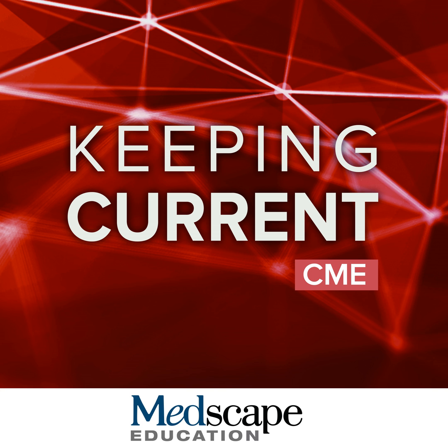Frequently, these contain thrombus. I showed the example of this already, where you've got a magnitude image which shows bright signal from the thrombus. You'll notice on the phase reconstructed image that the signal from the thrombus is completely nulled out, confirming, in fact, that this is thrombus on the phase image.